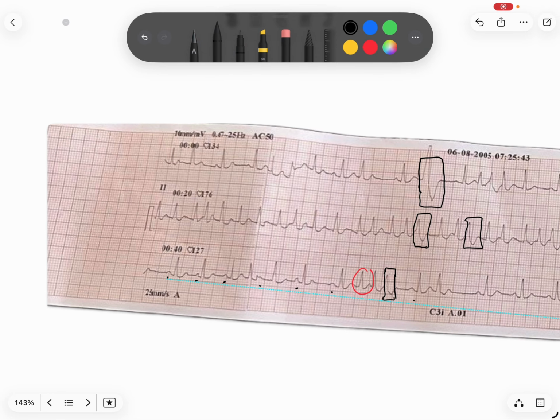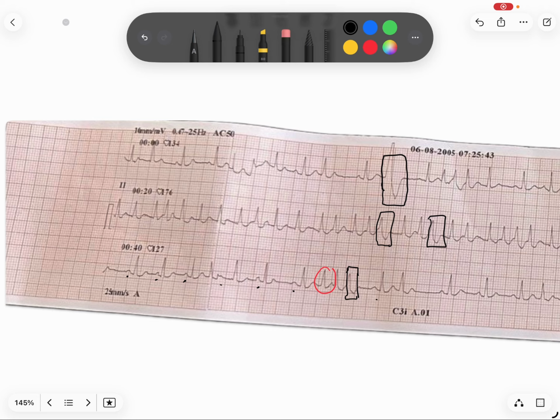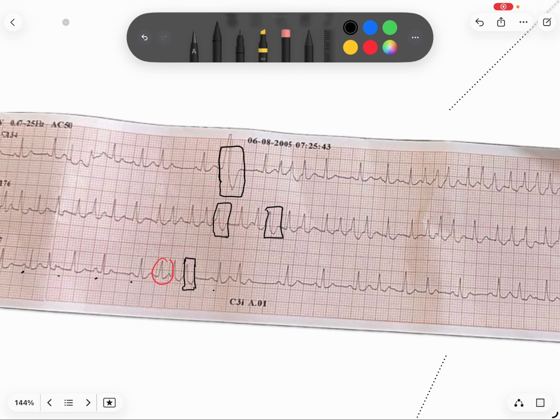Now, what to do about those? Those come from the ventricular muscles and not from the fast fibers, I guess. So, this patient is someone who has lots of conduction abnormalities with no real pacemaker and jumping all over the place.